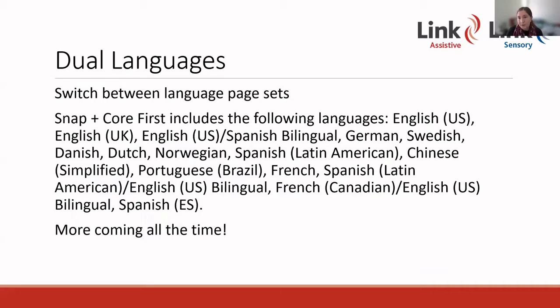Okay, so Tobii Dynavox Snap page sets are available in multiple languages, including all of those listed on this slide. But new languages become available all the time. So as long as your software is up to date, you'll have access to all the latest languages as they are released.